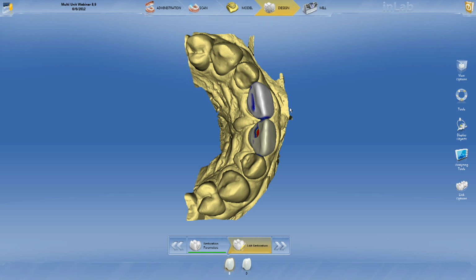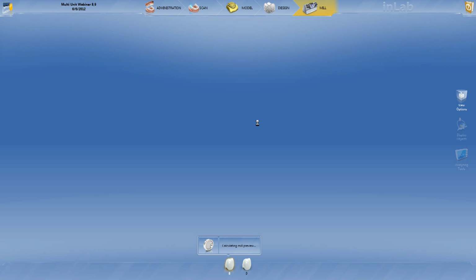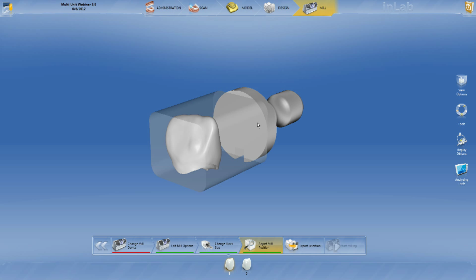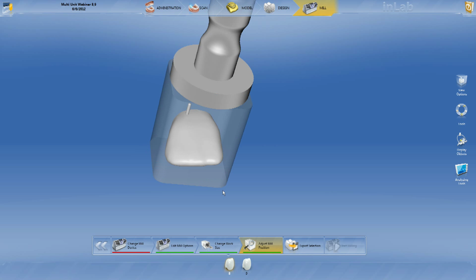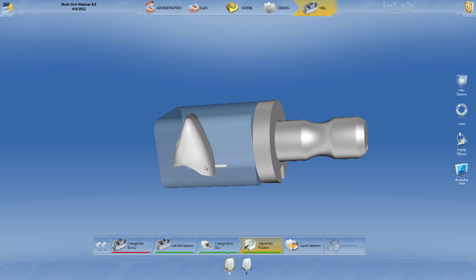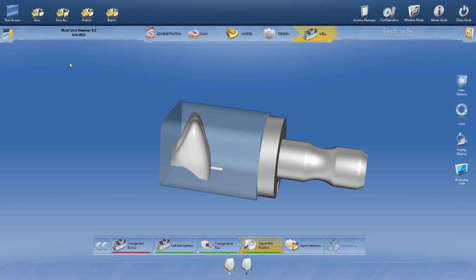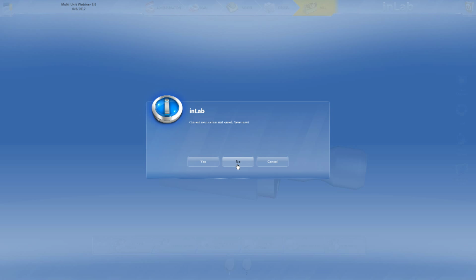And like I said, we move forward, and our crowns are basically done. I mean, of course, we would add whatever we want to do to it. We wouldn't actually turn them in like that, because we want to close everything up. So now let's move on to the big case. Like I said, I'm not really sure on the time. Somebody just brought me a clock here, but I'm not even sure what time I actually started. So let's move on to the big biocopy case that I'm working on here.